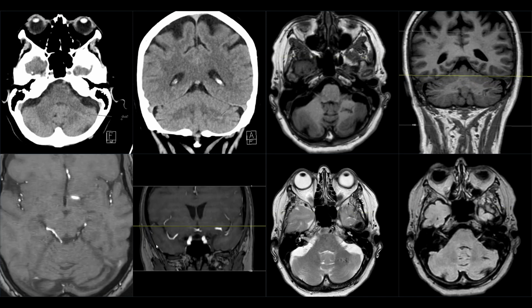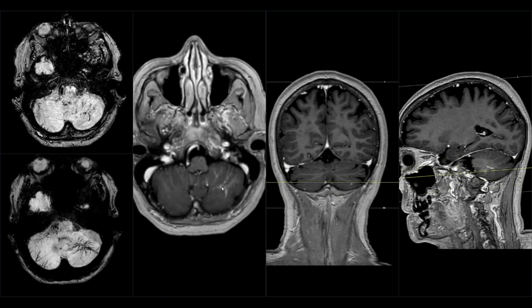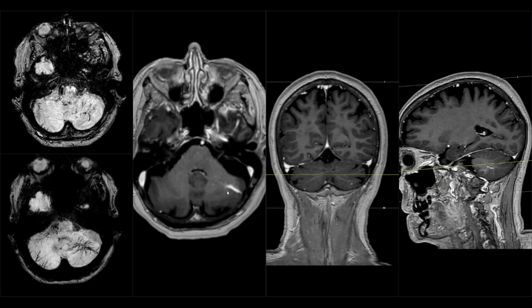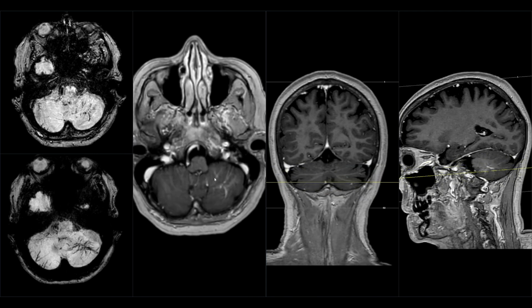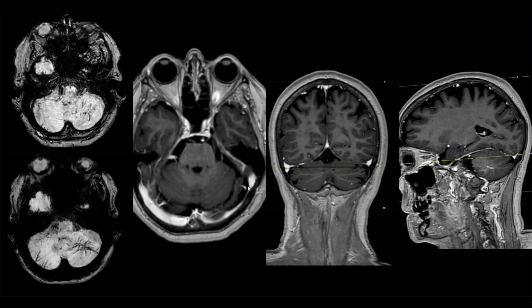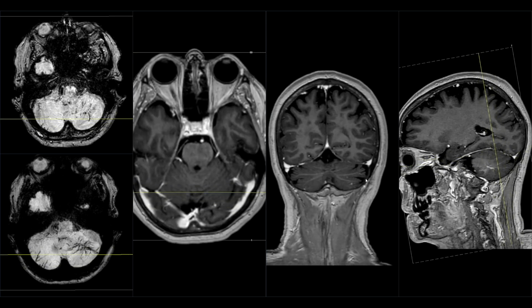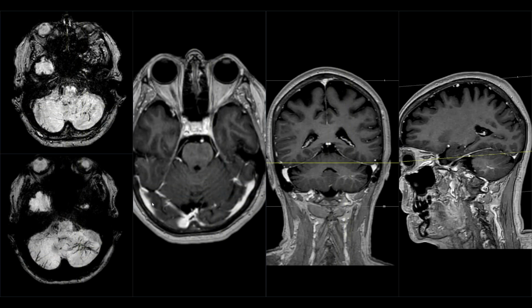So we had no arterial flow, just as we expected, and then we also performed the contrast study that confirmed very clearly the caput medusa appearance that is quite typical of the venous branching structure, and then a thicker stem that is draining towards the tentorium cerebelli venous sinuses on the left side, and you can see it on all sequences.